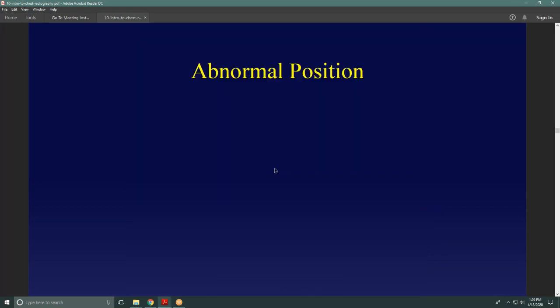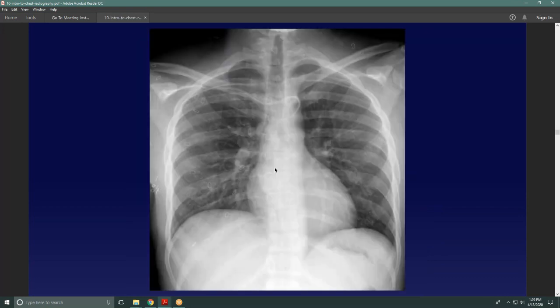There's your tip. So now we're going to talk about abnormally positioned catheters, okay? Now, this is an interactive portion. You guys can tell me where these things are going. Feel free to chime in. Where's this catheter going? Where's its tip? Come on, somebody sees this. Really? Nobody?